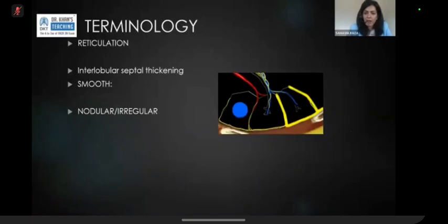If it's smooth, and it's the first scan that you're reporting, you can't really tell if that's permanent or temporary. If that patient is a heart failure patient, an inpatient that presented with fluid overload, has a large heart, has coronary calcification, is 85 years old, and has a bit of basal septal thickening, you're not going to go ahead and call it an ILD. You're going to describe it as smooth septal thickening in the context of cardiomegaly, etc., most likely a degree of fluid overload.